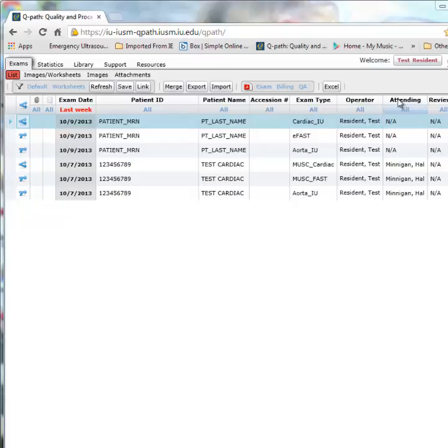If you remember in our example, we started a study, performed a cardiac, a fast, and an aorta exam, then closed the study. To view the first exam, click on the date under the exam date column. This opens the exam.